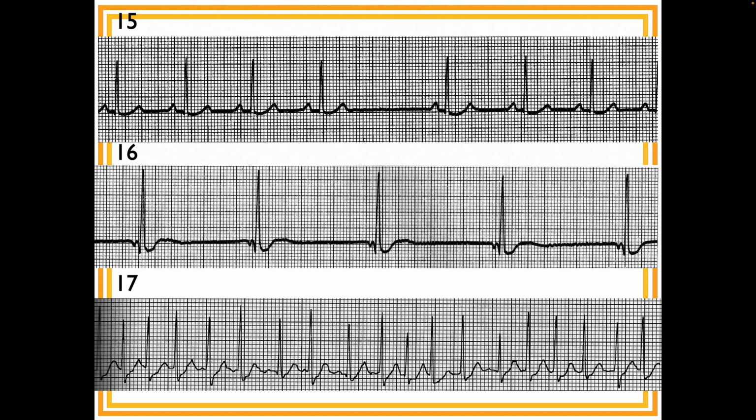The way you say it is, you can say junctional rhythm or junctional escape or even ectopic junctional, but not normal junctional. Junctional is not normal. It's just names, but just junctional rhythm is perfect. Okay, Brandon.